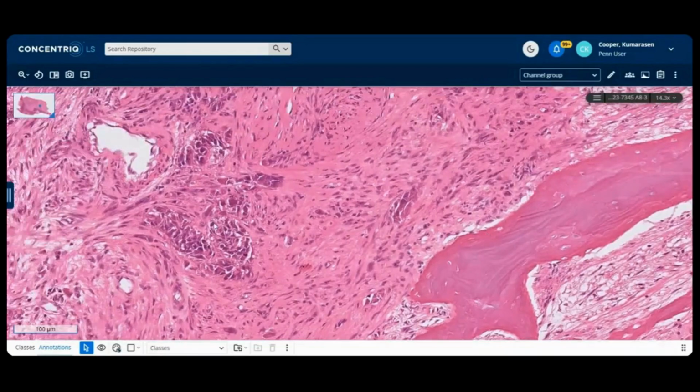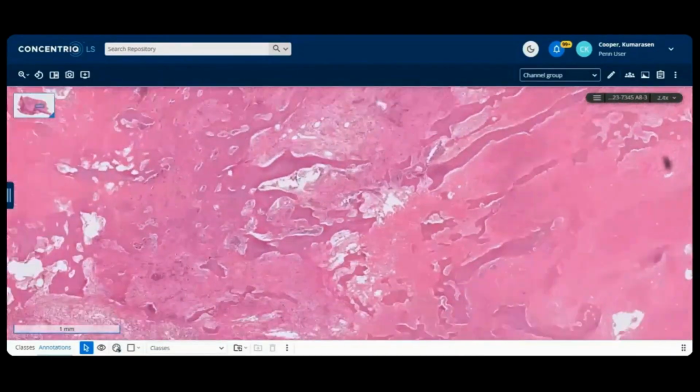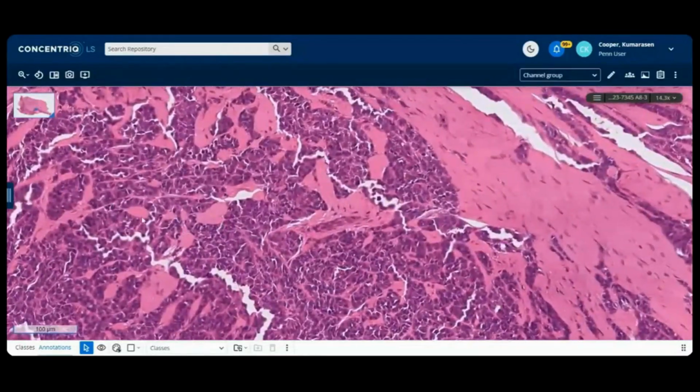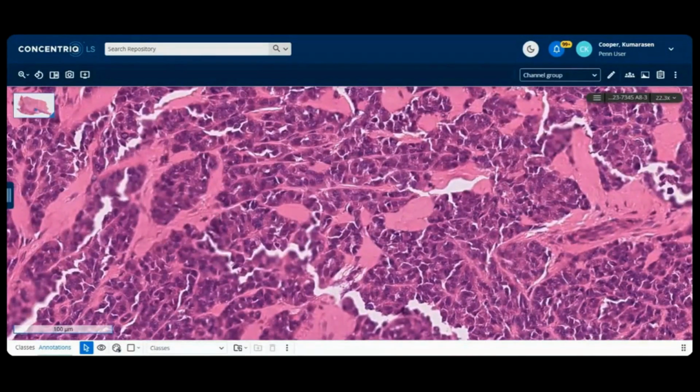Here you can see the tumor is quite viable. Little islands, nests, single cells, cords. Let's go back to the main mass. Here we go. And on high power again, just to show you the morphologies. Pretty decent morphology. Reasonable amount of cytoplasm, more than reasonable. Looks a little pinkish, eosinophilic. Nuclei, a little more epithelioid, sort of ovoid.